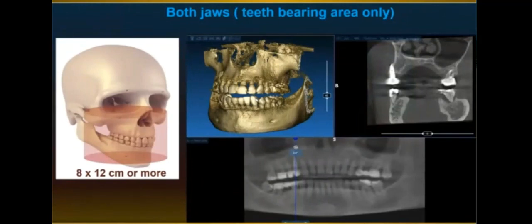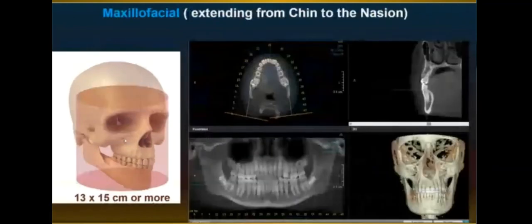They make a huge artifact, more than having one alone. In addition, it's easy to check the implant planning if they are separated, because you can remove the jaw which is not the jaw of interest, and check the implant planning.